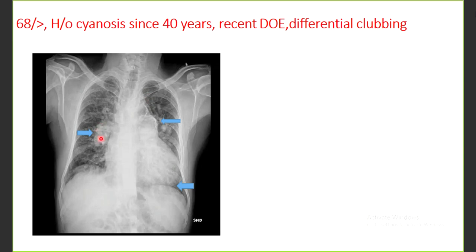Another patient X-ray. Look at it, you know that this patient has significant cardiomegaly. There is calcification at the level of both pulmonary artery and aorta. Calcification along the aorta is noted whenever there is long-standing uncontrolled hypertension, especially in elderly patients.